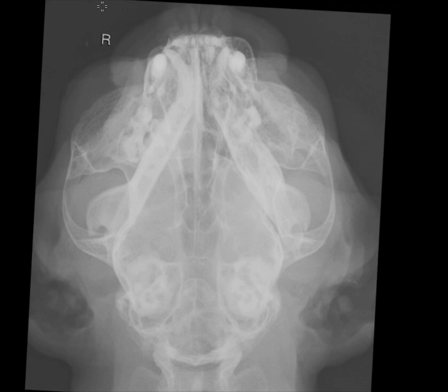In this case, I see a difference in the opacity between the right side of the nasal cavity, which I'm outlining here, and the left side, which I'm outlining here. The key to this case will be how much confidence can I put in this observation given the obliquity. So, using the nasal septum, which is here and is relatively undisrupted, I can see that on the right side of the nasal cavity, especially here I can see without being superimposed and here, that there's a general increase in opacity. So I'm comparing, for example, the opacity here and here to the opacity here and here.